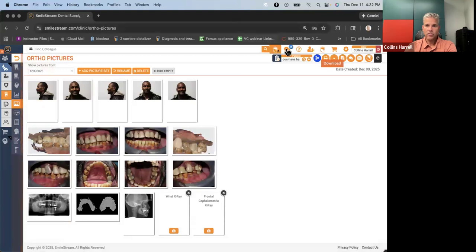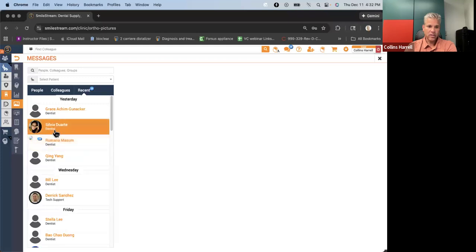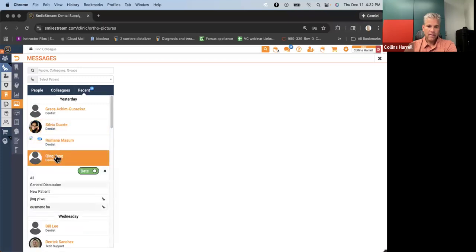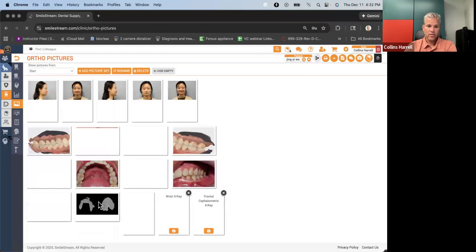Let me open up that patient. If I recall, this patient looked very skeletal closed. Yeah, so here is the patient.